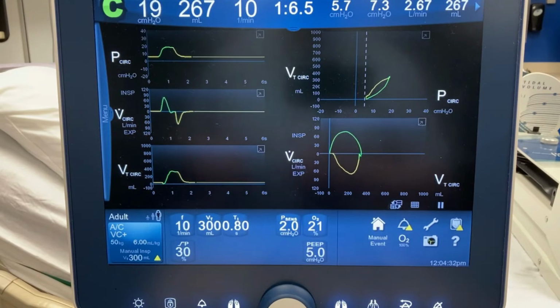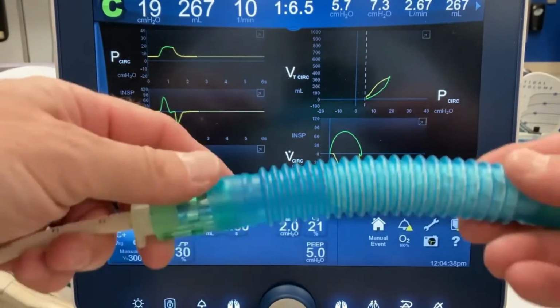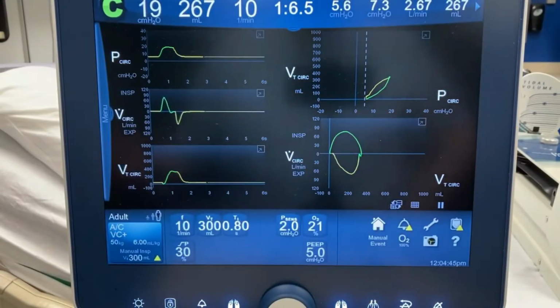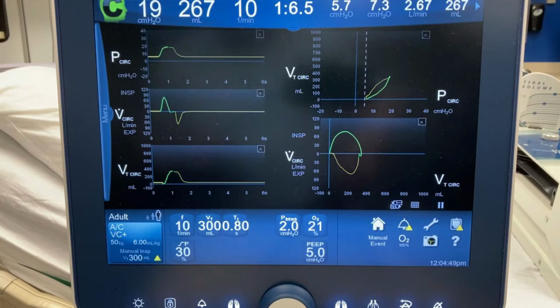It has no airways or any kind of resistance. When I add resistance, I'm actually going to be using this small ET tube and some corrugated tubing with some paper towels and tissues stuffed in it for my resistance. So again, that's not going to be like real life, but we'll do the best we can.